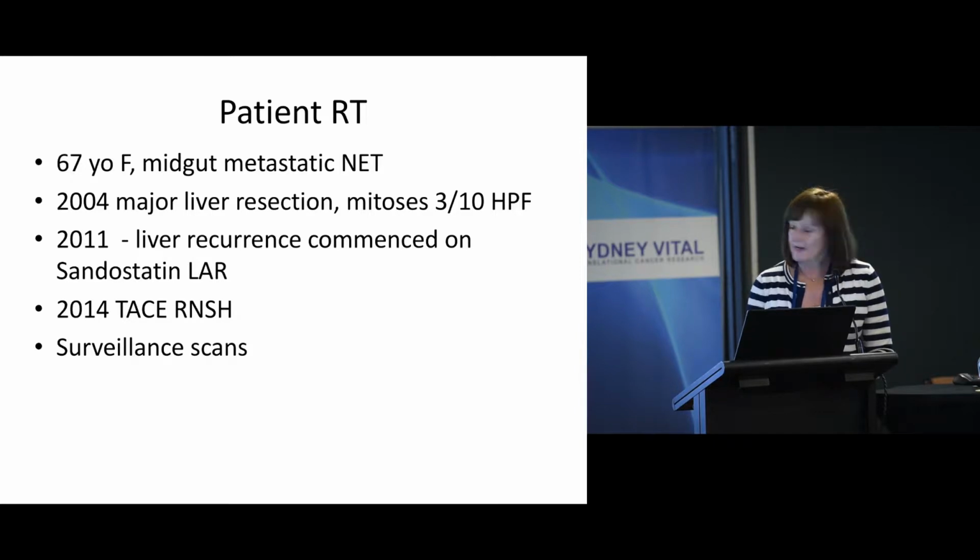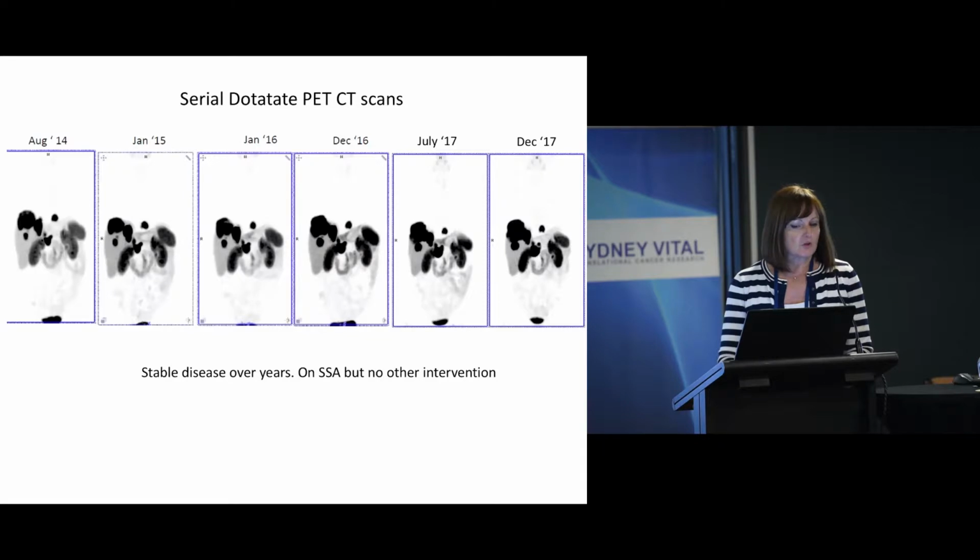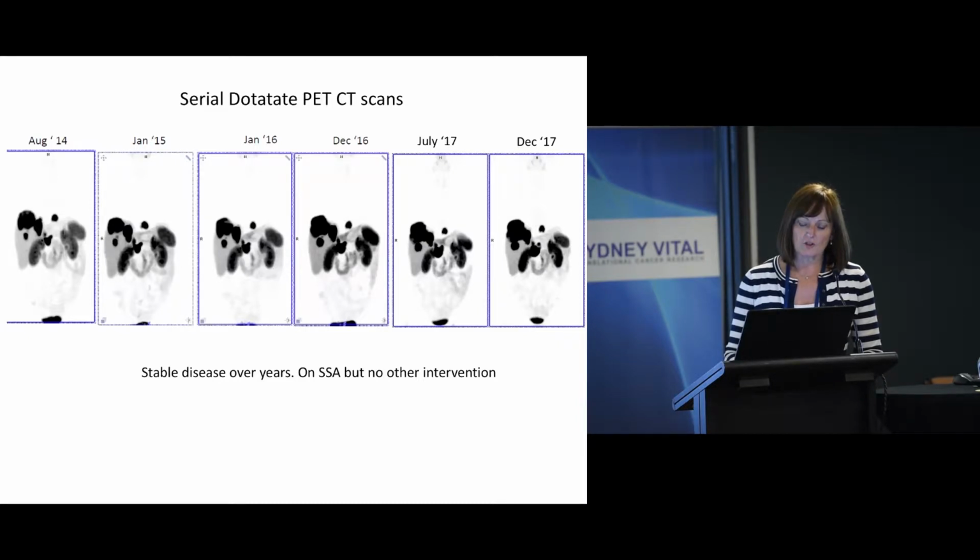I'm really hoping this mouse will work for me. Yeah. And the disease she's got is hepatic disease in the liver, upper abdominal nodal disease, and a paraesophageal node here. So looking at her there, she's quite well. We don't look at her for nearly a year. Things are very similar. And on we go, just annual surveillance or 6 monthly just to check.